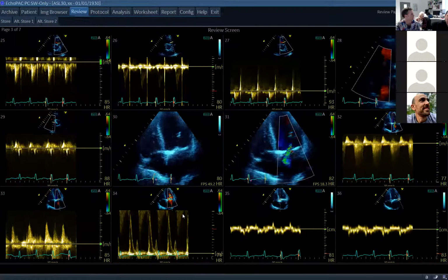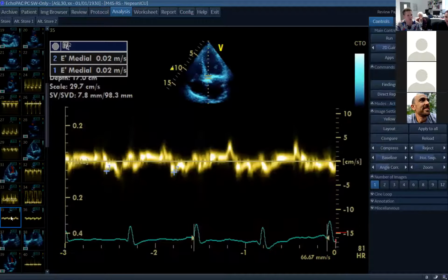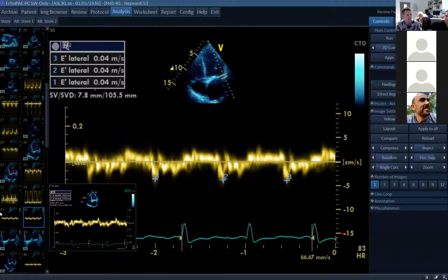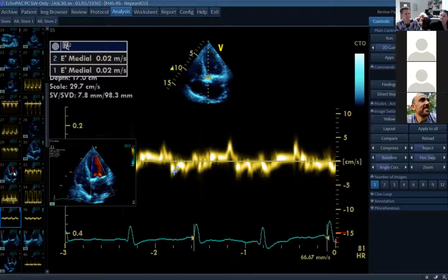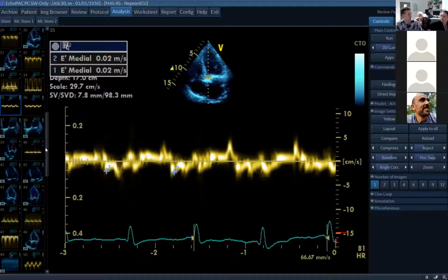Sorry, the diastology then. Do you just say indeterminate? I think you can use other things. I would argue that you've got to say there's significant diastolic dysfunction because we've got these E primes. E primes are really good in the critically ill. I think they talk about impaired relaxation, and if you've got the MR as bad as it is, severe MR, I'd say significant diastolic dysfunction. That's a wonderful word to get you out of trouble with raised left atrial pressure. So if he's got signs of CCF, we'd be saying that there's a significant valve problem in there.